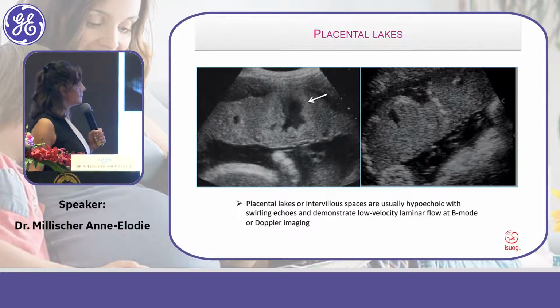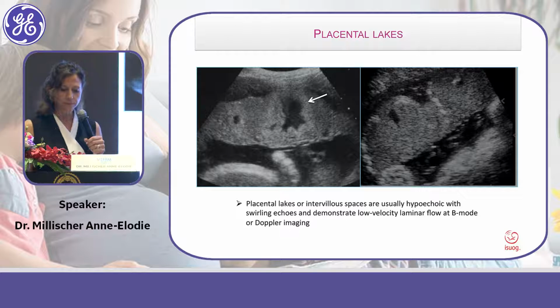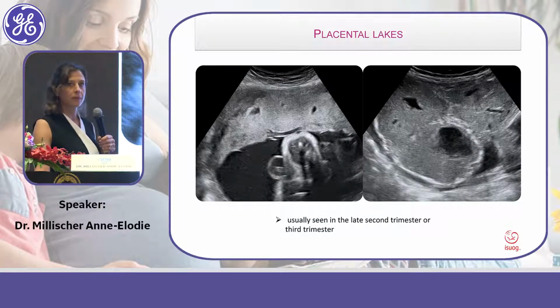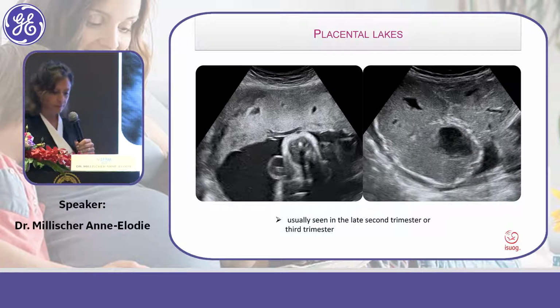Và để các bạn phân biệt đây là một cái hình hồ huyết bình thường, nó khác với lại một cái hồ huyết ở trong nhau cài, thì đó là nó được viền bởi một cái đường echo dày bên ngoài, và khi các bạn bỏ Doppler vô thì nó thường sẽ không bắt màu.